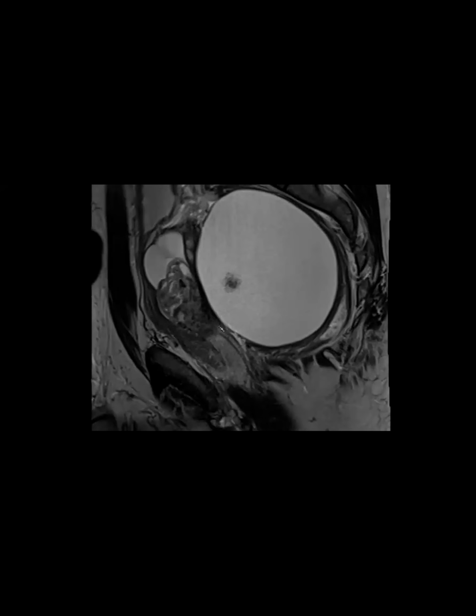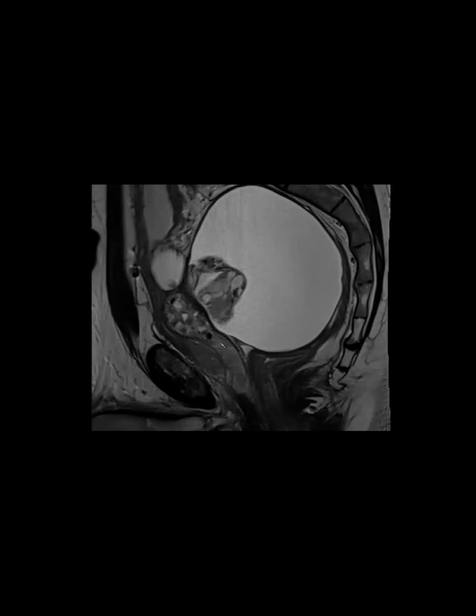So here's our prostate. And the lesion is kind of affiliated with both the top of the prostate and possibly the seminal vesicles. I'll show you the coronal too if you want it. I know it is kind of gnarly, but it's very cool, right? Doesn't it look like art? It's got lots of interesting elements to it.